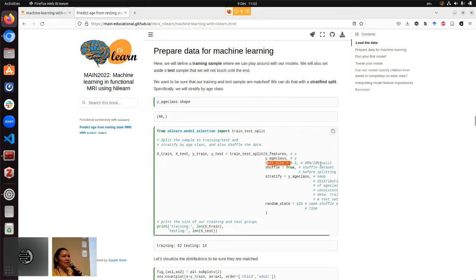If you want to understand the more detailed reasons why we need a training set and a testing set, I recommend you look at the recording of another parallel session we had this morning for the machine learning one. Here we're just going to show you the scikit-learn functionality for doing this.